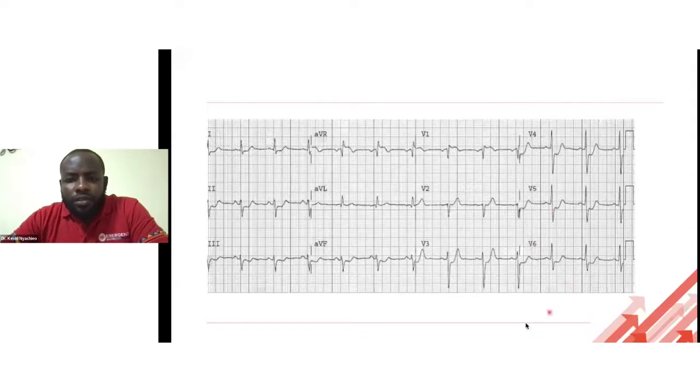So this is usually what we call an aVR STEMI. There are two mechanisms. An aVR STEMI represents two types of mechanisms. One, it could be just diffuse subendocardial ischemia, okay? And this is actually usually the most common one, where you get ST depressions in lateral leads, okay? And you get reciprocal changes in aVR, which is the elevation. This is the most common one, okay?